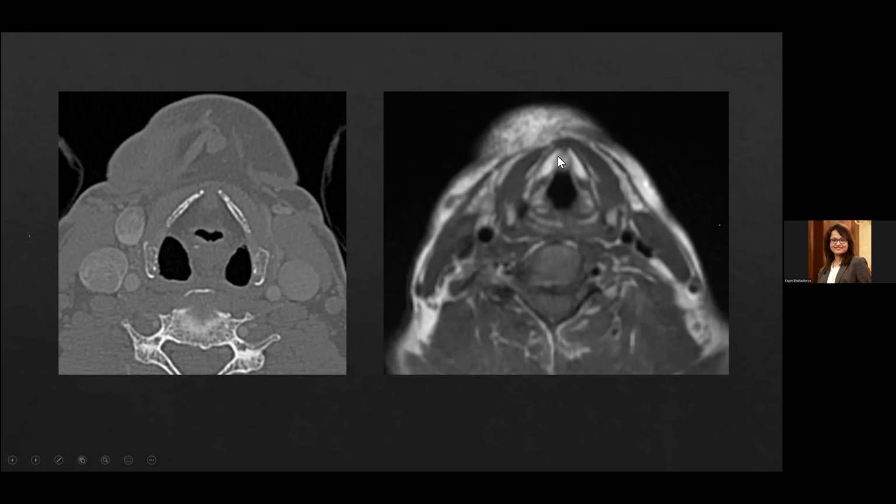Another important role of MRI is identification of the prevertebral fascia. So I will show it to you in this slide. This is the cricoid cartilage, which is again partially ossified. The central part is hyperintense and the cortex is hypointense. Posterior to it is the postcricoid area and the posterior pharyngeal wall. This line of fat which we are seeing here, this is one prevertebral muscle and this is another prevertebral muscle. So this line of fat delineates the prevertebral fascia and the prevertebral muscles from the hypopharynx, and therefore the intactness or breach of this shows whether the prevertebral fascia is invaded or not.